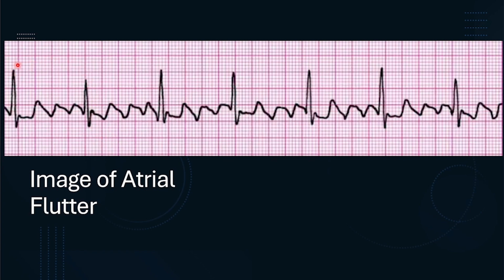You can see here we have our QRS complexes. Now these match up, but along the way we have our atriums firing off complete but rapid beats. So if we compare our QRS complex, and if this was a 6-second strip, it's 1, 2, 3, 4, 5, 6, 7 times 10. So that's going to be a heart rate of 70. But if we look at our atriums, they're quivering like crazy. And the ventricles might be slowly contracting, but the atriums are contracting extremely quickly, because they keep on repeating in this loop, the re-entrant circuit.